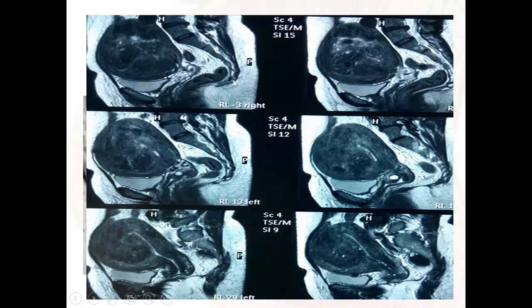This is another case of adenomyosis. Here you see the adenomyosis is ill-defined, and you have invagination of the endometrial glands within the junctional zone. So this is a case of adenomyosis. Some people say, why not a degenerated fibroid? In the degenerated fibroid, we have non-uniform bright signal spots in T2. We have a bizarre-shaped appearance of the degenerated fibroid. Okay?